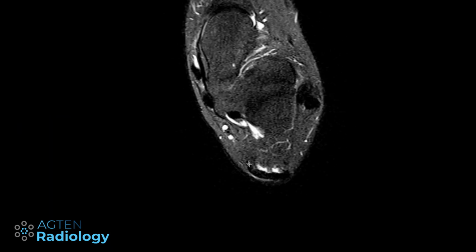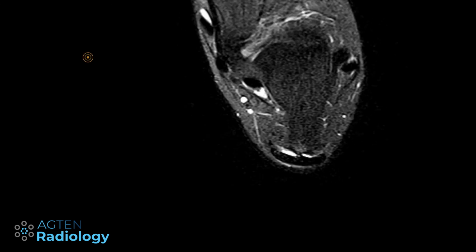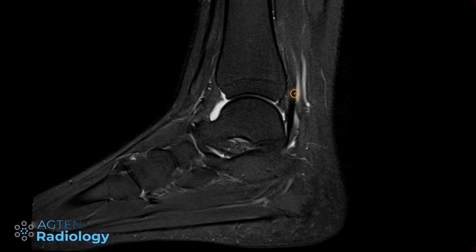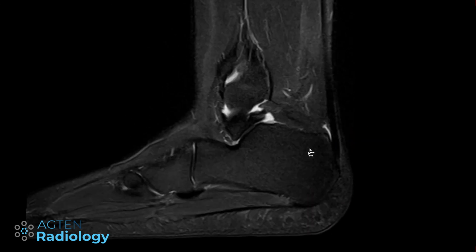Measure the transverse diameter, and we would get something close to 11, depending on where we measure and how far we measure, maybe up to 12, also a little bit too much. And whilst we are here, we can also try to measure the AP diameter one more time, just to make sure we are measuring it correctly. So it's up to 2 millimeters. That means that based on those findings, this is actually a little bit too much and can be considered abnormal.